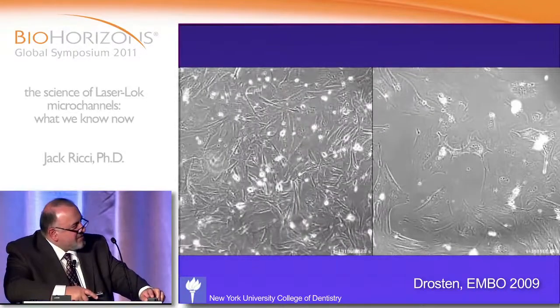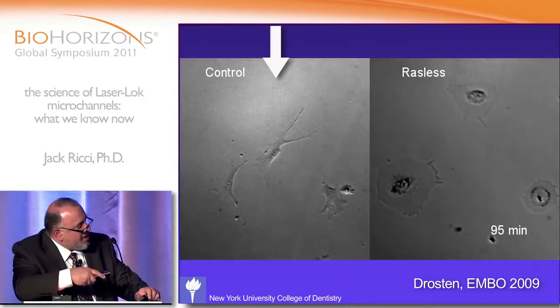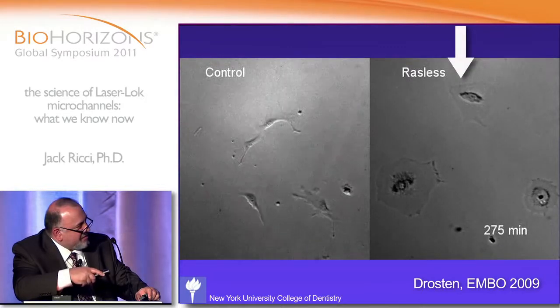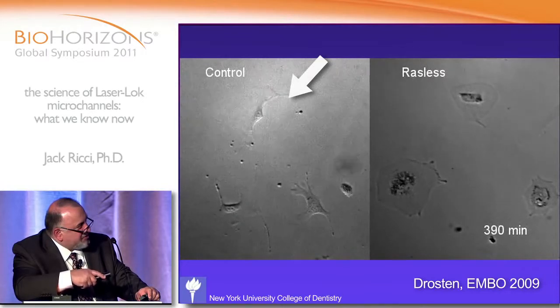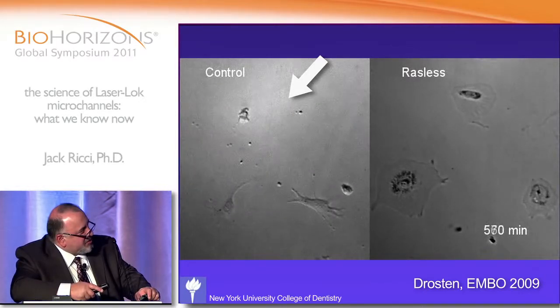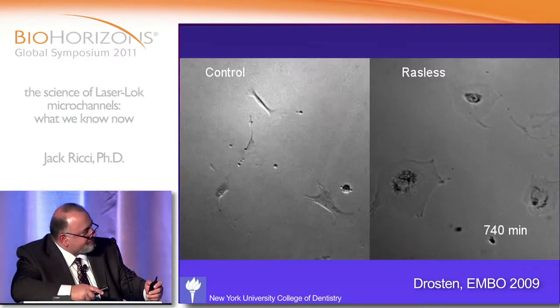And if you look at cells on an individual level, here, you can see these cells are migrating, and they're sort of doing a random walk. These cells are not migrating at all because they've had the RAS knocked out of them. And essentially, this cell is going to undergo cell proliferation. You're going to see two cells there in a couple of seconds after it rounds up right now, and it's going to split into two daughter cells, and you're going to see the two cells migrate away. So that's very typical cell behavior on a flat surface.